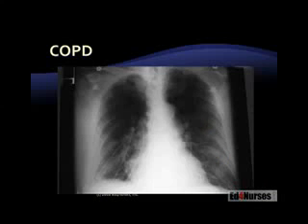Now, what we have going on in this patient is some kind of hyper-expanded lung. So let's go through our 5 steps. First of all, we're going to assess for lung expansion. So we're looking at those lungs. We're following them down to the diaphragm. Now, you notice how the diaphragm here seems to be a little bit more flattened out than it was before? In that normal chest X-ray, we had a nice diaphragmatic arch at the bottom of our lung. Here it's more flattened out. Look how flat that diaphragm is going across the bottom.